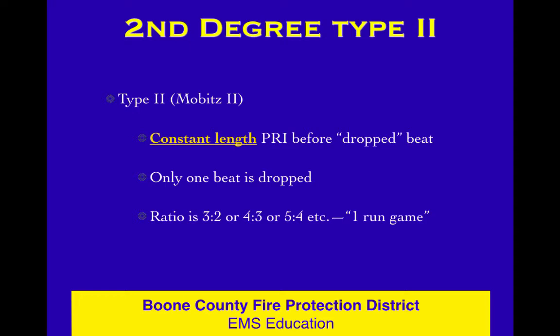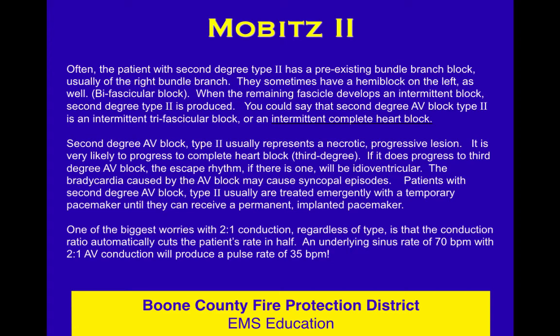We're only dropping one P wave. And when you look at that dropped beat, then you see that the PRI is constant. Now here's a good long screen, and those of you that are fire service instructors are freaking out because I have completely violated the maximum number of words on a PowerPoint slide, and I'm just not worried about it because you're going to get this in a PDF. You can read this over and over.